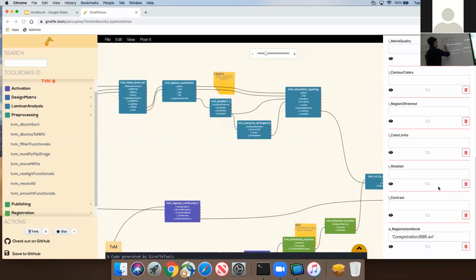Maybe there is some 5% of this layer, and well, some 40% of that layer, and then some, I don't know, 25 of your third layer, and then there is still 30 left for your CSF.